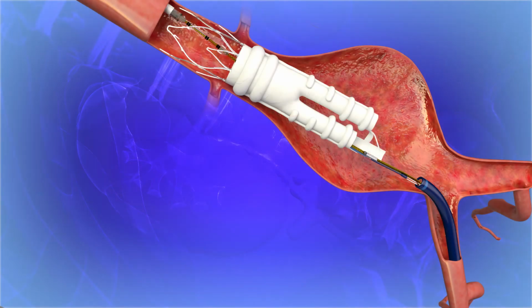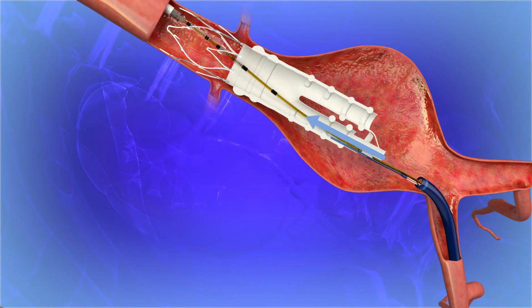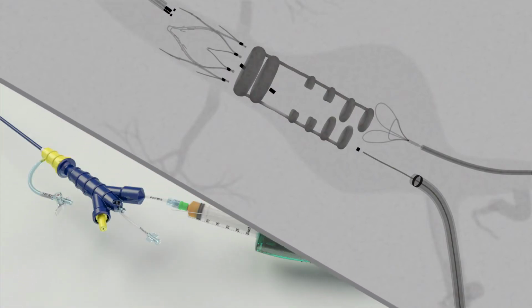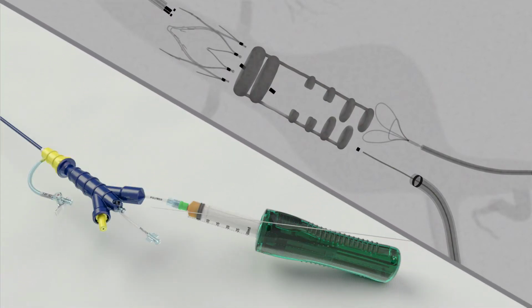A second option to attain contralateral gate access is through the crossover lumen, which is integrated in the aortic body delivery system. Insert and advance a snare catheter to the desired location near the aortic body leg of the contralateral side. Insert an 018 guide wire through the crossover lumen port on the handle.